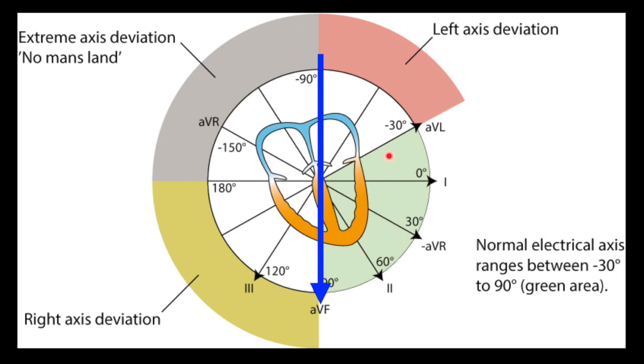Now that's cool. You could leave off that for the most part and just say that for the most part, that's going to get most of it. However, there's this little triangle up here. So we could actually add in a third line just to clarify that a little bit. This is essentially the 0 line.